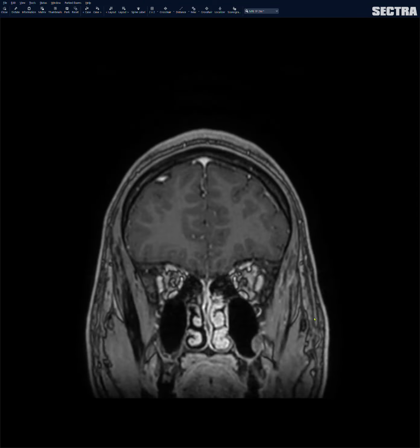I look centrally in the brainstem, thalami, deep gray matter, basal ganglia, and finally I look at the bilateral cerebral hemispheres, looking for any kind of abnormal enhancement, anything I might have missed on the 3D. Okay, so I look at the parietal occipital regions, bilateral temporal regions, and then I like to use a sequence to look at the bone to make sure there's no enhancing calvarial mass. Okay, and I take a really quick look at the soft tissues, make sure there's no abnormal enhancing orbital mass, make sure there's no abnormal enhancement in the masticator space or an enhancing parotid mass or enhancing nasopharyngeal mass.